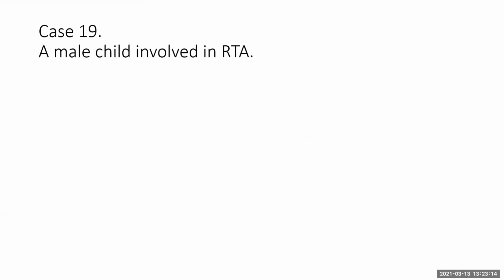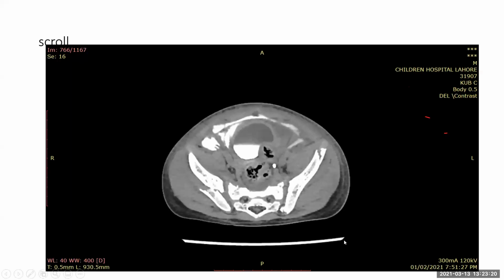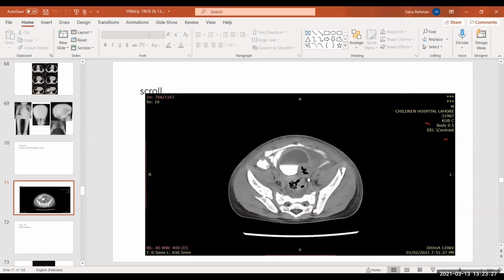Okay. So a male child involved in RTA. So this is a CT. Just a moment, let me put up the... Can you see this now? Can you see my screen?